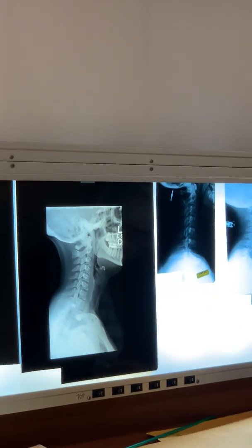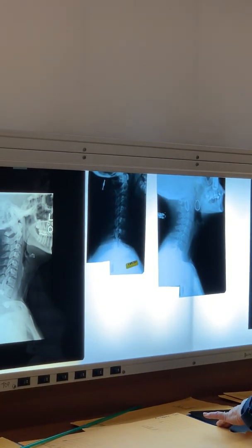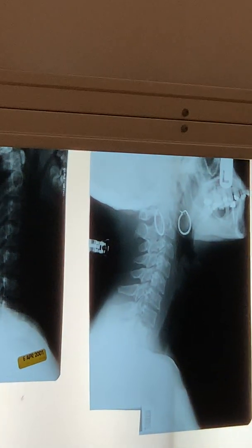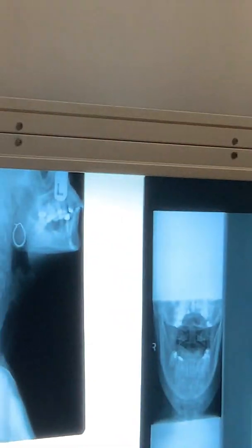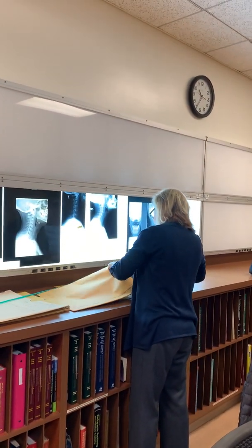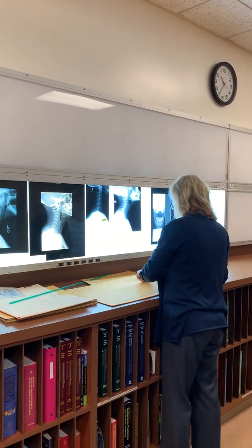What is it, a hair tie? Is it like a hair clip? Oh, yeah, you're right. That's exactly what it is. Who said that? Good job. Come on, you do your hair every day.